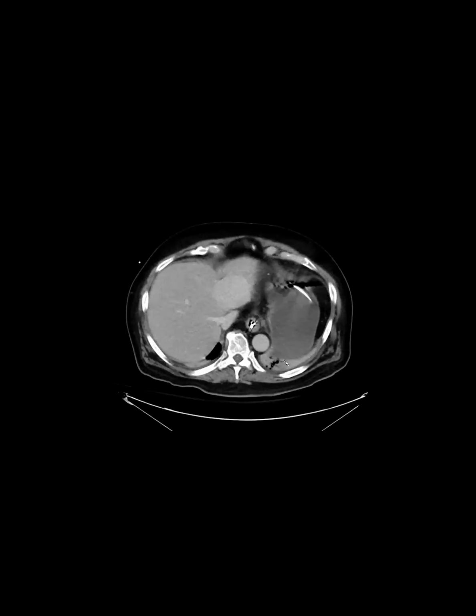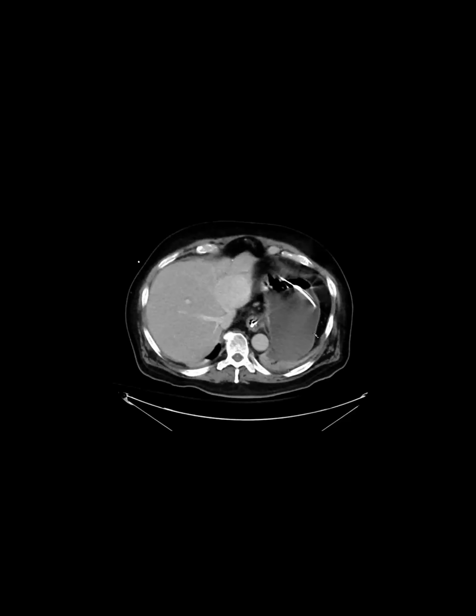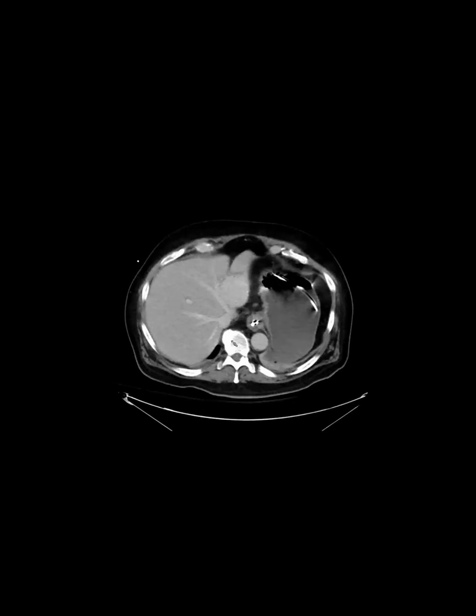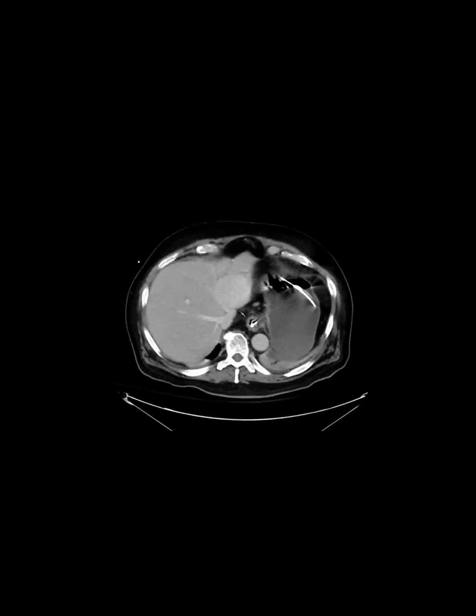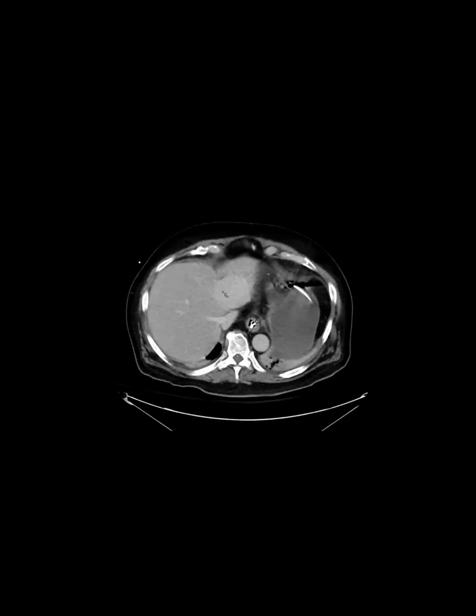We did not put it together with the missing spleen. They had trauma like 20 years earlier, but in 75% of cases of splenic rupture, you will find some splenic tissue somewhere in the abdomen. So this one just kind of attached to the capsule and tricked all of us. So the teaching point here is if there's a missing spleen and a mysterious mass either somewhere in the abdomen or even attached to the liver, think about splenosis.